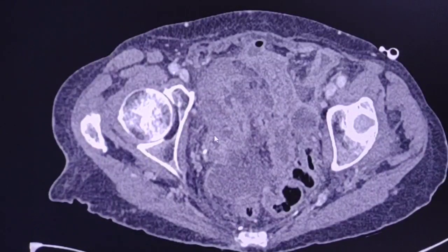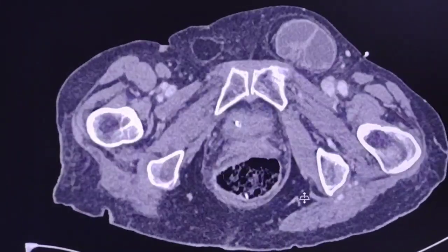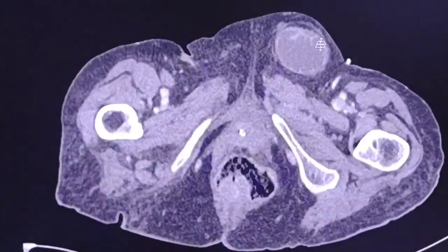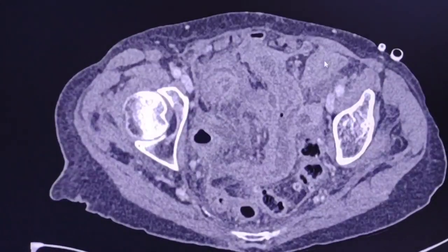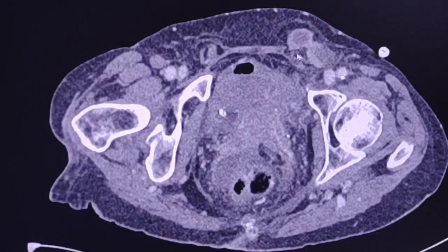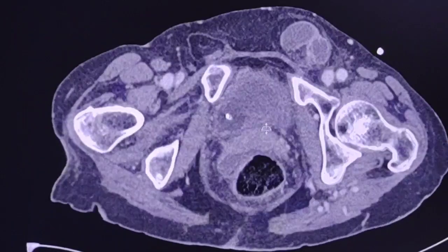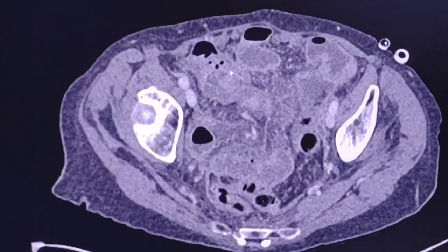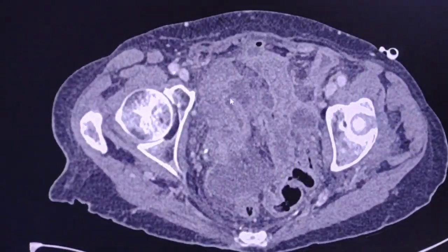So in conclusion, there is small bowel obstruction associated with left inguinal hernia, which is definitely incarcerated because the involved small bowel loop is dilated, and there is dilation proximally to that point, and there are ongoing inflammatory infectious changes in the pelvis involved with free fluid and locules of fluid and collections, and there is definitely involvement in the region between the cecum and the ileocecal valve, and of course the appendix.